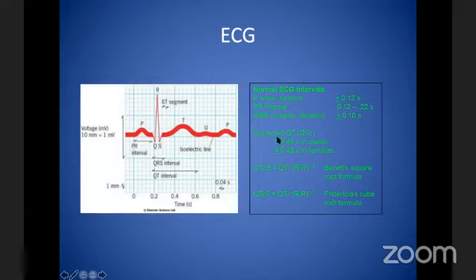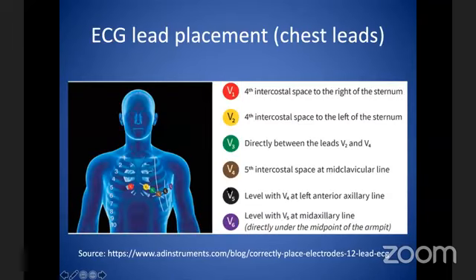And then the QT interval, we will come to that later, but just remember the difference in males and females: up to 460 milliseconds, or 0.46 seconds, in females, and 0.44 in males. And we'll touch base on this later. This is an important slide to understand.